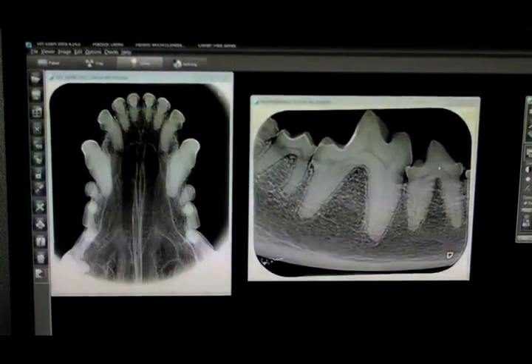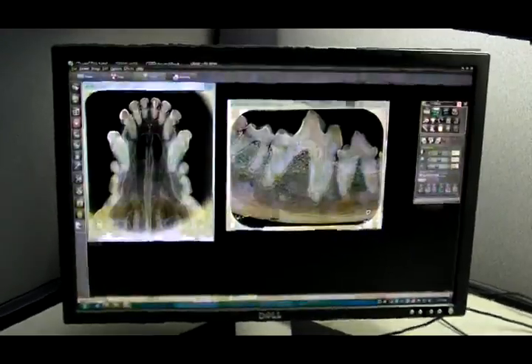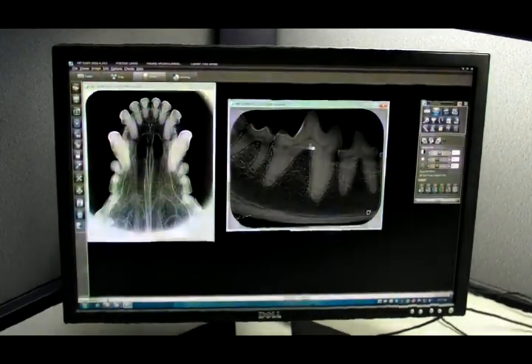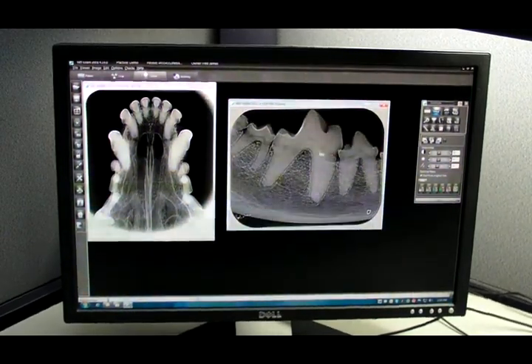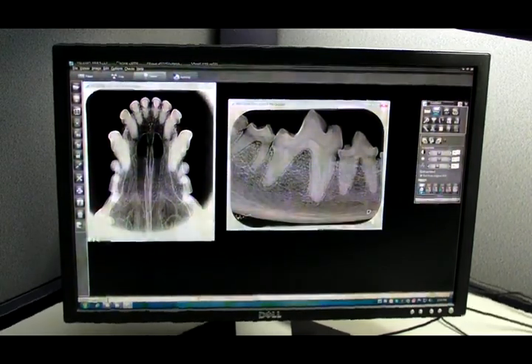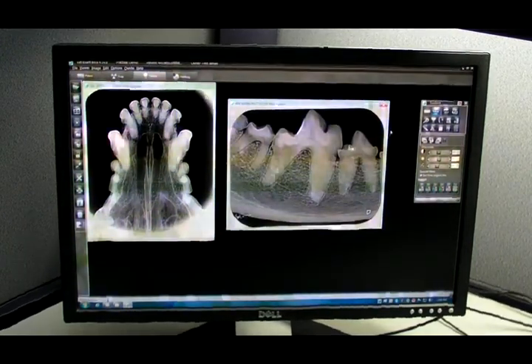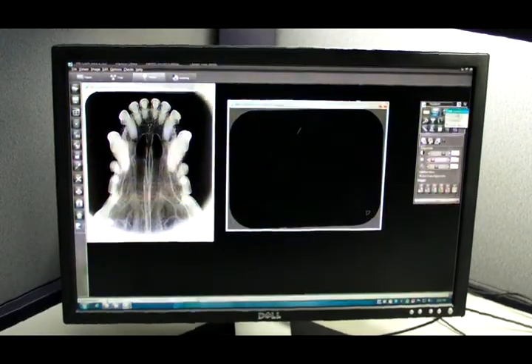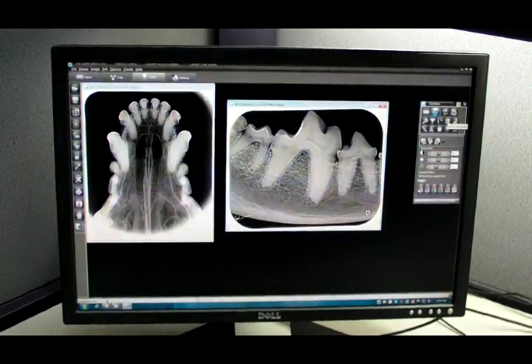You have lightness and darkness controls, making sure that the tools are on X-ray. You can left click and hold, and then left to right is lightness and darkness, up and down is contrast. You can also change the filters at this point if you like, but even if you completely ruin the image, you can always go back to first saved, which was the first save you did in the X-ray mode.